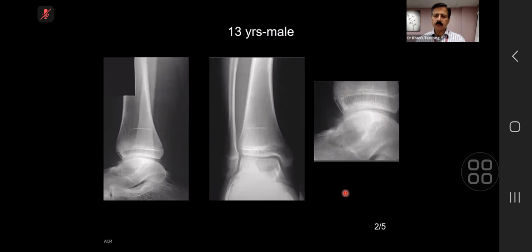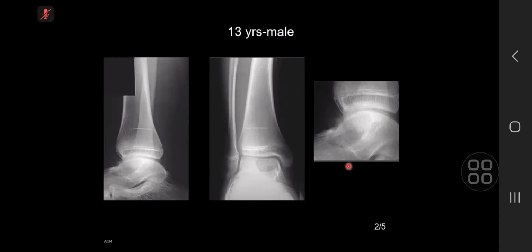Please carry on. There's no surrounding periosteal reaction. There is some pixelation, it's a zoom view, but it appears that the soft tissue is slightly hazy just adjacent to this lesion. There's no fracture through it. And there's a single lucent lesion with benign features in the dome of the talus on the medial aspect in a 13-year-old patient.